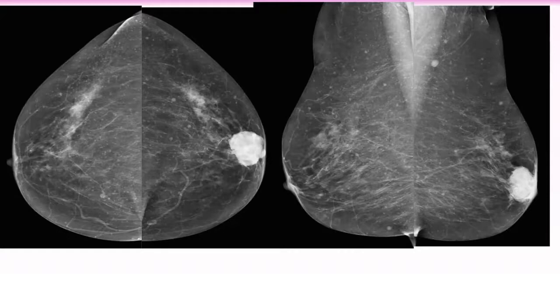No. You are thinking about cysts, fibrocystic change, you mean? But why do you think about fibrocystic? Can you characterize this lesion more? What about the distribution? They are diffusely scattered bilaterally in both breasts.